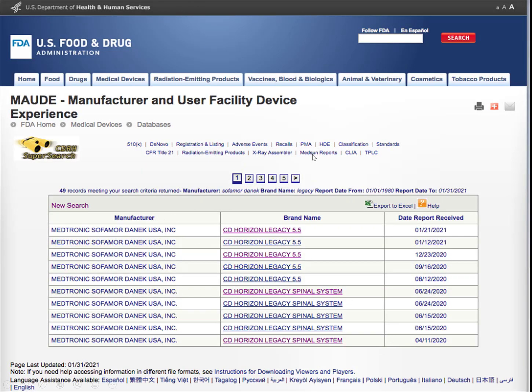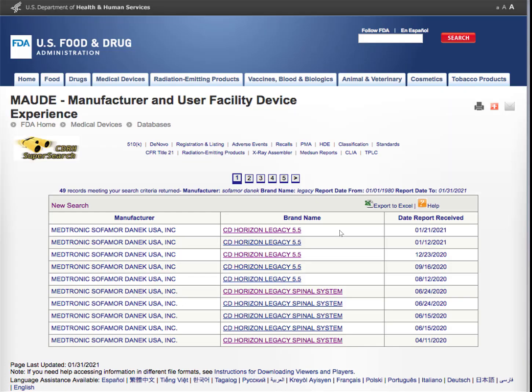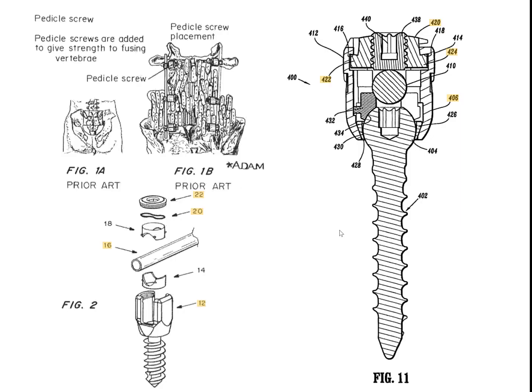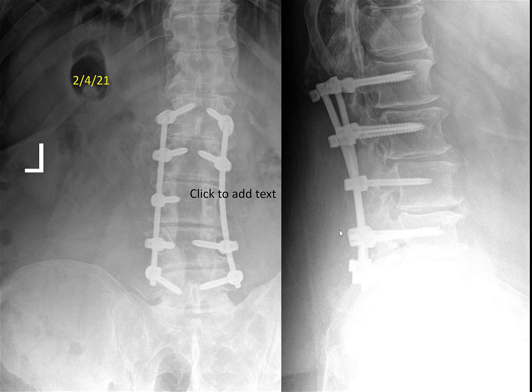So, I mean, kind of incredible, right? So something's wrong with his screws. He's got loose screws. And my thoughts, do you want to make any comments? No, popped off and the rod's moving. Yeah, the rod's moving back and forth. So what does this mean?